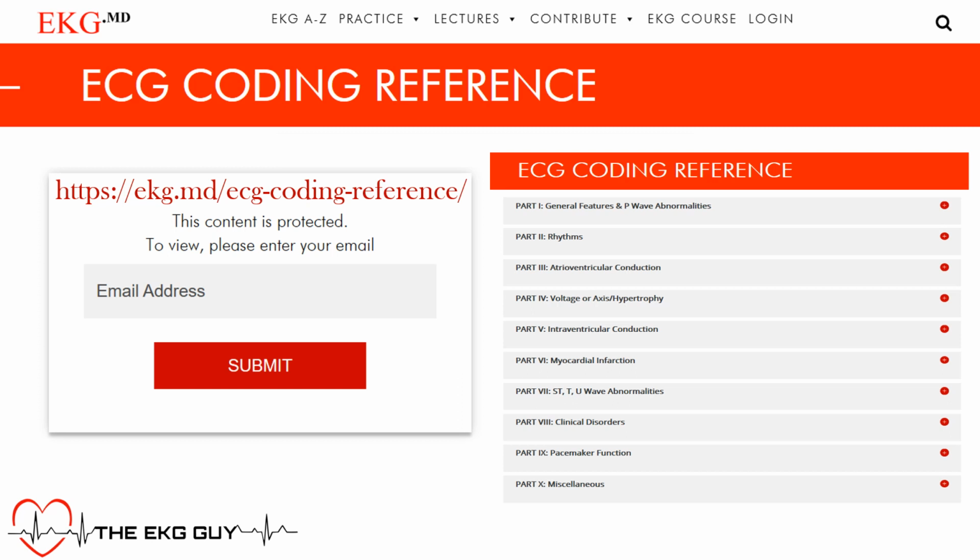So we've been going through our EKG coding reference guide online that's available and also in print, but where we're at now is we're going through atrial flutter.